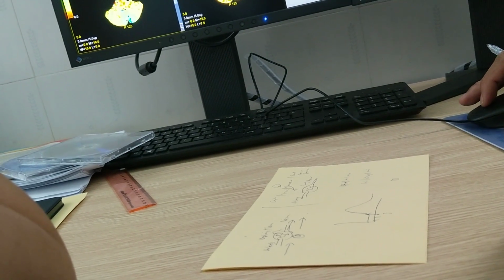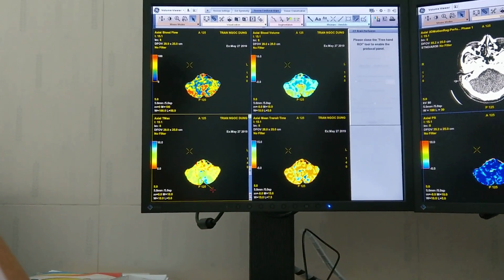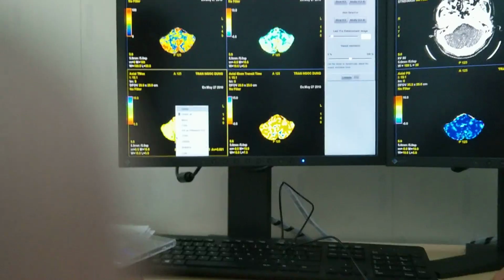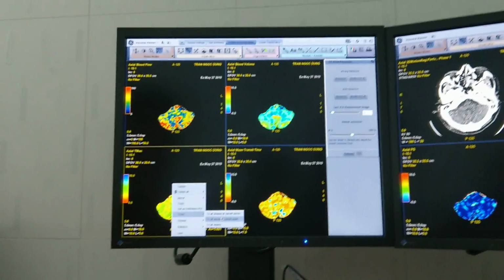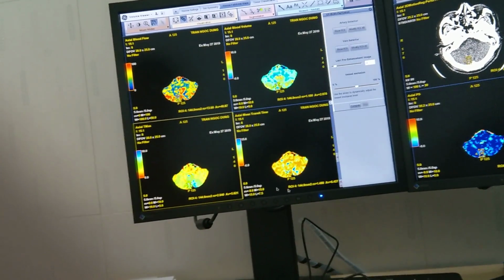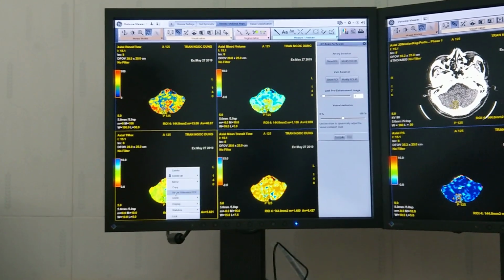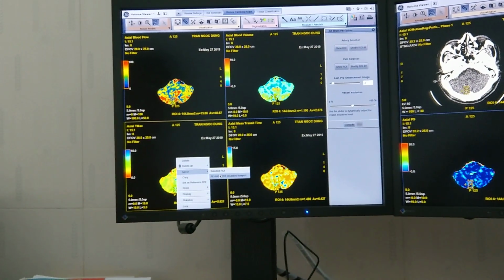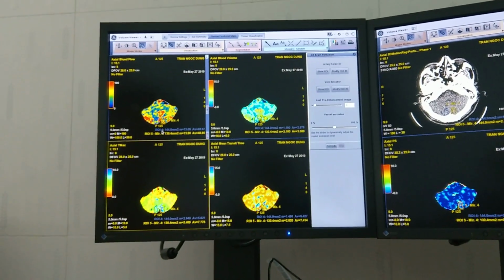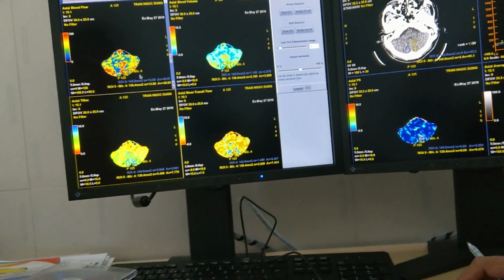So sometimes you always want, for example, all the white matter, or you just can focus on this here, okay, and then you can compare and clone. Because you want all the same, right? So all series, you have all the same. Then you want to look at the other side, so you can mirror, all visible. So all is comparing each other. Right? So ROI 4 and ROI mirror 5.